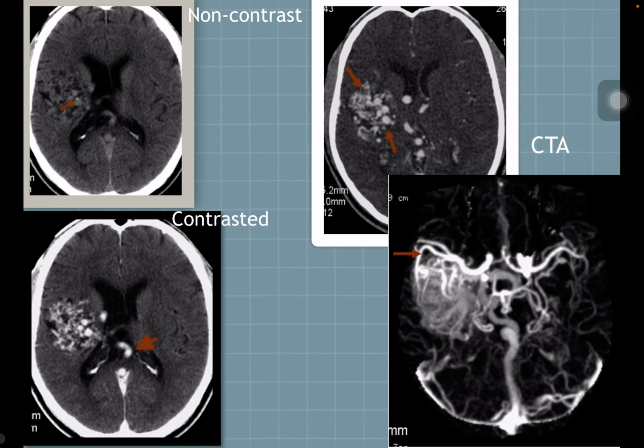Here is the axial and parasagittal view of CT angiogram, showing that the distal branch of the right middle cerebral artery is involved in arteriovenous malformation. Early venous filling of the deep cerebral venous system and the straight sinus is demonstrated.